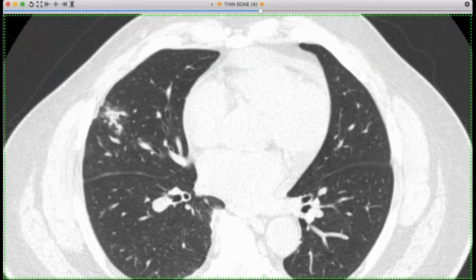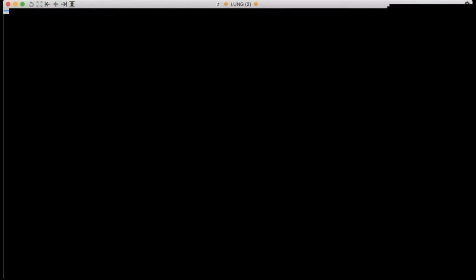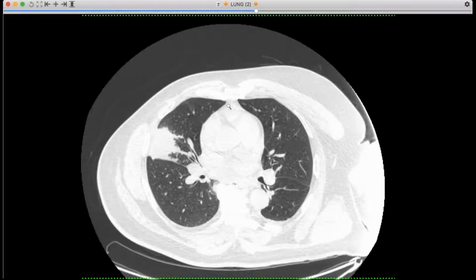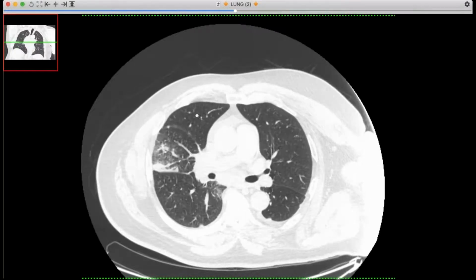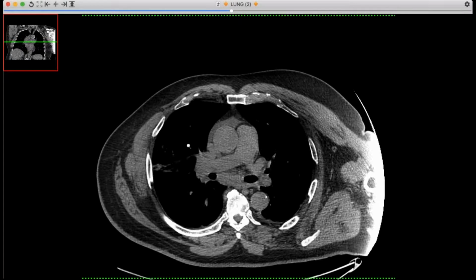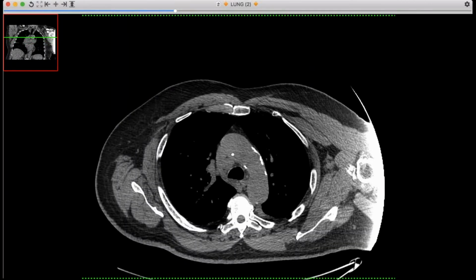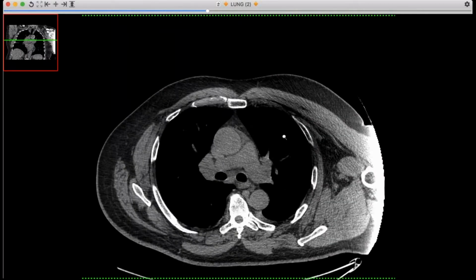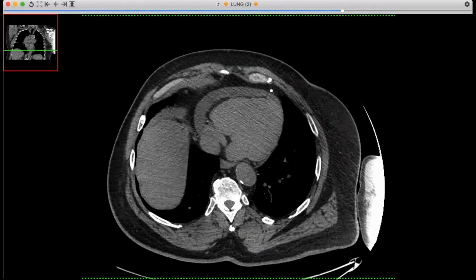it was suggested the patient see a pulmonologist, which they got scheduled for, and then they went for another CT. Now we're fast forwarding 4 more months, and then I'll put them all up side by side. In that 4 month period, that little branching thing became this large, ugly mass. There's also now new subcarinal and right hilar lymphadenopathy, also lower paratracheal and upper paratracheal. He had a pericardial effusion on the previous CT too. And there's his pericardial effusion.